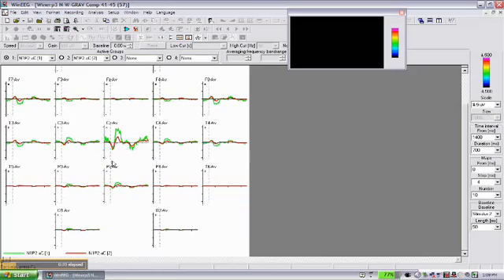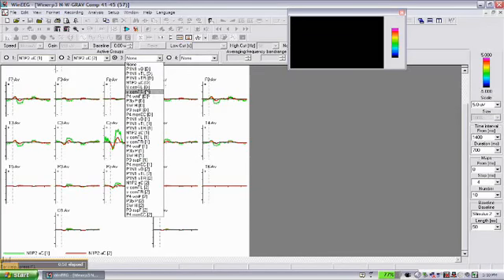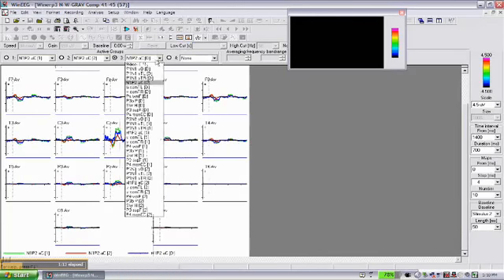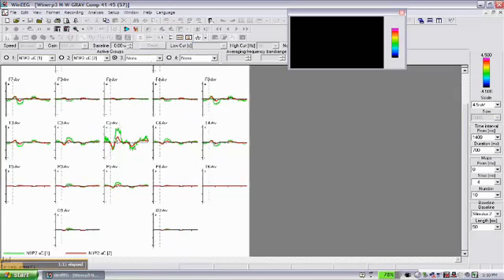And in this case, the N1 part of this component is quite normal, and the positive part, actually this is the P3A component, is a little bit higher than in norms. The P-value was not big, so I wouldn't say that it's statistically different.